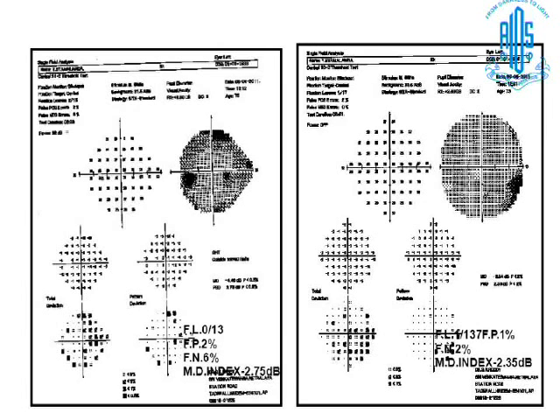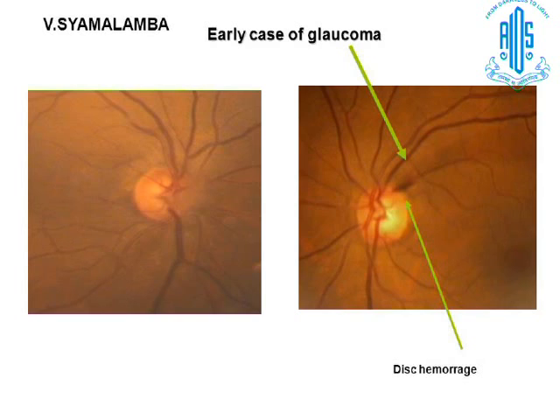This scotoma should be on the lower side. Therefore, there is a predominant upper arcade defect also, which we are not able to pick up in the fundus. See the fundus, the notch is there, but we pick it up because of this, corresponding to the 10-2.